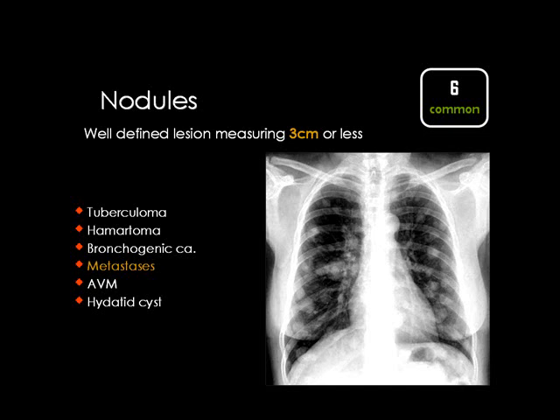Try. No? Very good. If you cannot, this is a solid rule and very good in clinical practice. If you see a pulmonary nodule in the lung, it is most likely one of these 6 nodules. Then we start the differential diagnosis.